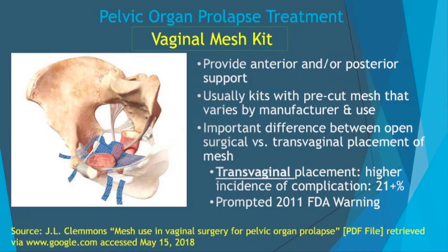Well, now let me turn to the mesh. What does mesh look like with ultrasound? Well, mesh, as I stated before, can be variable. It depends on what organ is being supported. And so in the old days, like about 10 to 15 years ago, surgeons would just take this material and sort of cut it out themselves, sort of estimate what they need, cut it out, and then put it in the pelvis.